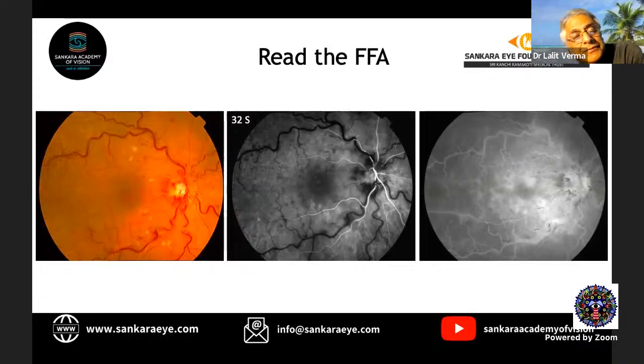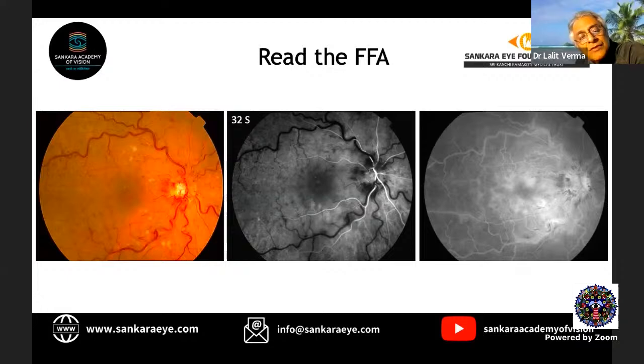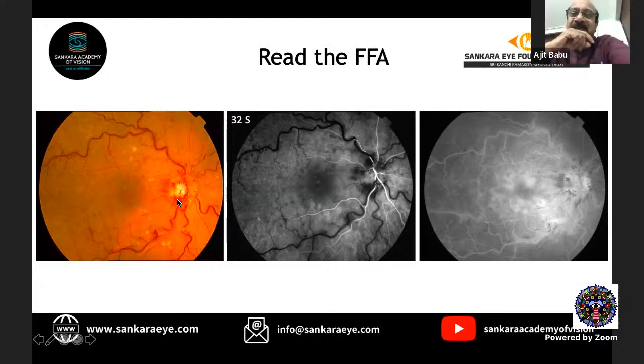One more read. Sir, this is the right eye fundus photograph showing tortuous vessels. Another thing you should say is tortuous vessels in virtually all the quadrants: upper temporal, lower temporal, upper nasal, all vessels are tortuous. There are cotton wool spots involving both superior and inferior fields, and there is hyperemia of the disc, maybe suggesting neovascularization. Just limit yourself to hyperemia.